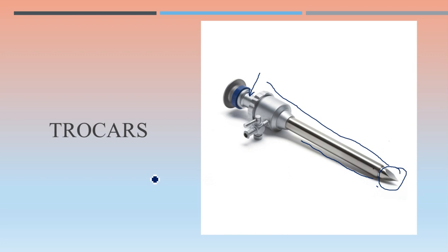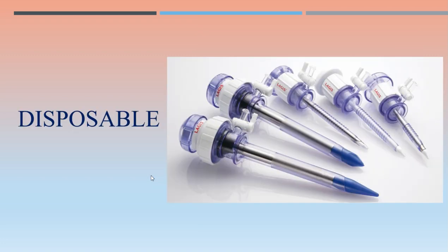Trocars are basically of the disposable type and the non-disposable or reusable type. This is how a disposable type of trocar looks. Various sizes are there, between 5 mm and 12 mm.